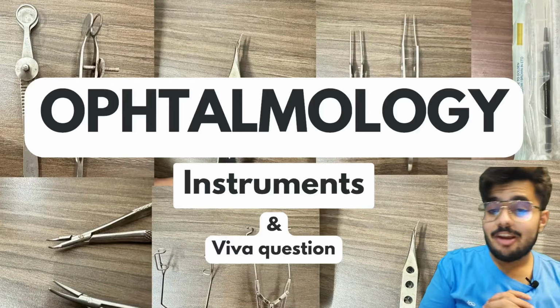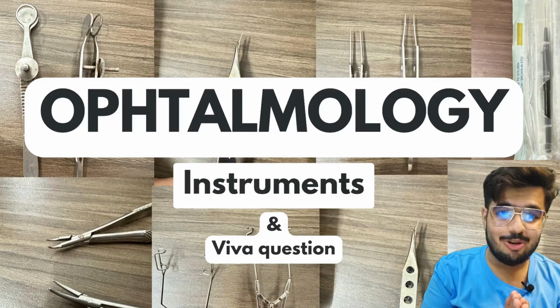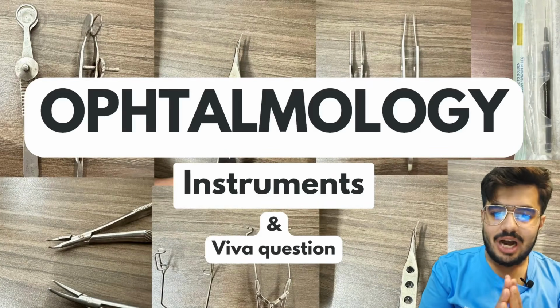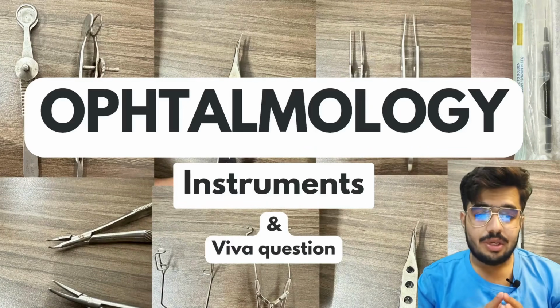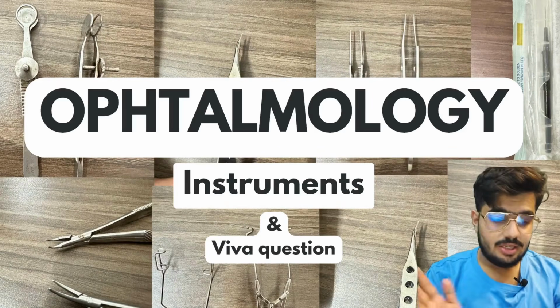Today we're going to learn a very important topic, that is instruments in ophthalmology. So ophthalmology के वाइवा में एक टेबल होता है instruments का. I will try my best to make you understand the most common instruments that I use in our minor OT and OPD and which are asked in Viva. So let's start without wasting any time.